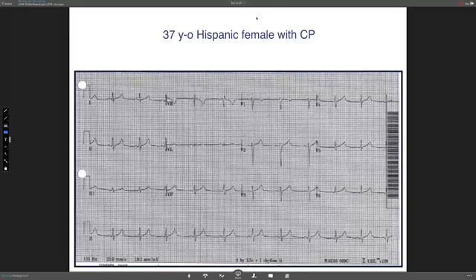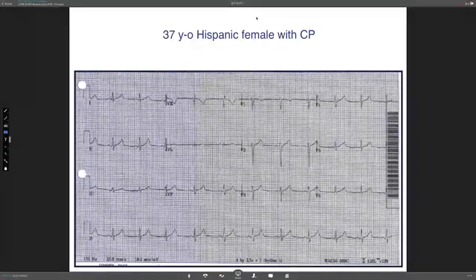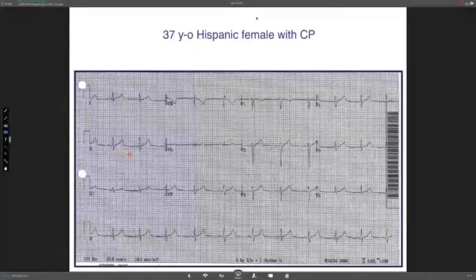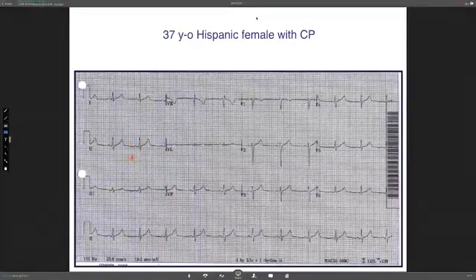What do you think, guys? Khalid and Yousef, you think normal overall? Yeah, I agree. It looks like a normal ECG. Sinus rhythm. A little bit, I thought, a little short PR interval here, let me just use my pointer. I thought the PR is a little bit short here, but again, it's not a big deal, I think.